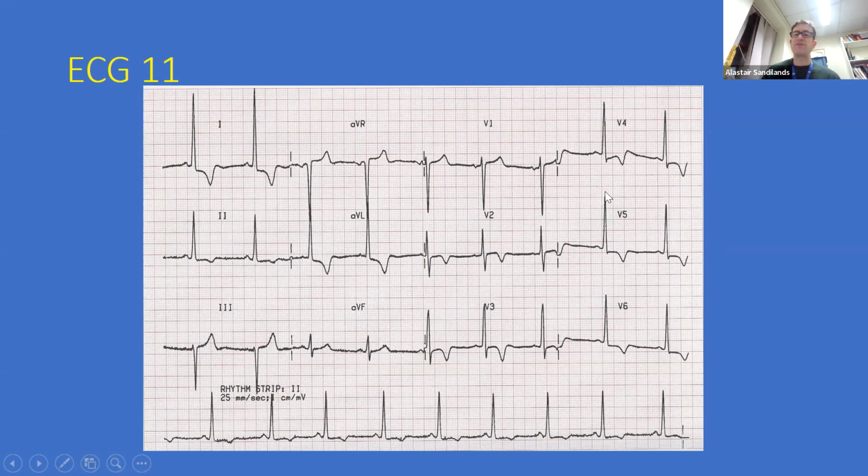The R wave in V5 and the S wave in V1 add up to probably over 35, and there is T wave inversion. This is over 12.5, clearly, and AVL plus S in V3 is definitely greater than 25. Each of these squares is 5, remember, 5 millimeters. So you've got T wave inversion in the anterolateral leads associated with tall R waves in the lateral leads.